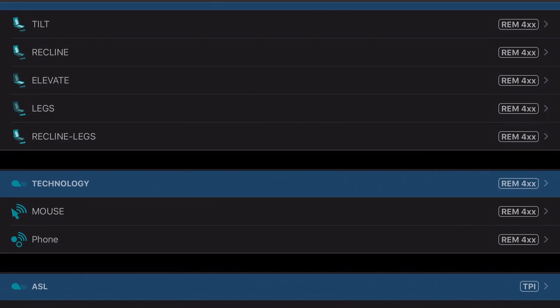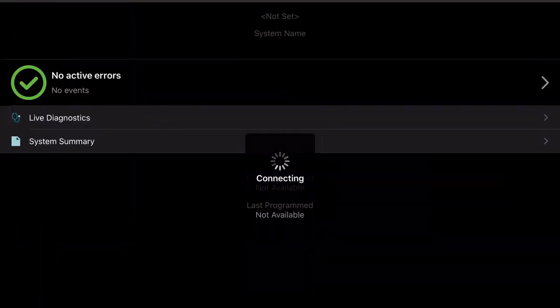So we're going to tap write, and then I'm going to come back and show you the programming screen plus the display so that you can see what it looks like for the patient. Okay, so I'm going to tap write, and it will start working, and I will be back with the look of what the display looks like once it's connected.